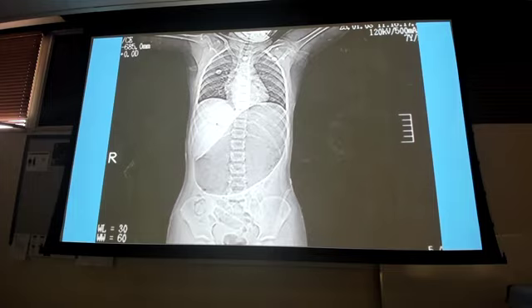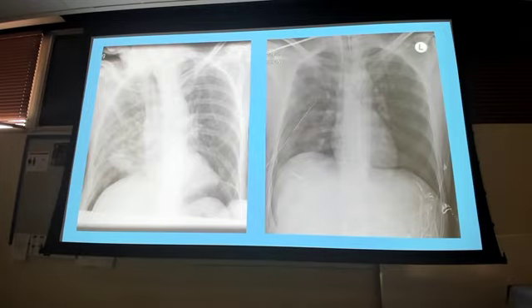What do we call that one? Air in the stomach, but also dilation. Right? Dilation, look, it's another peds. This very rarely happens in adults. Very rarely happens in adults. Okay.